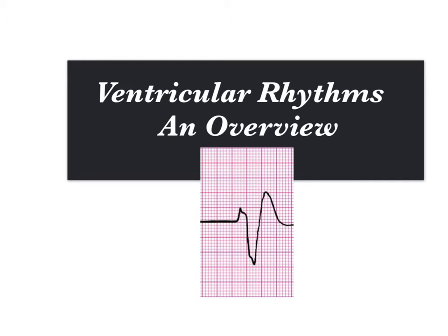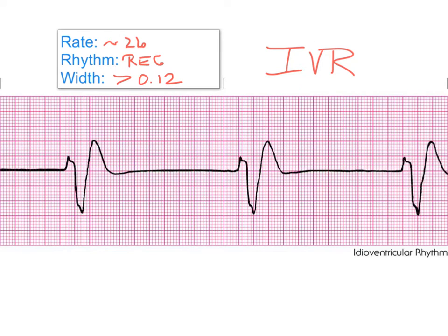I'm trying to get you moving on. I know it seems like a lot coming to you, but continue to work on your rhythms, and I'm going to throw in a couple more ventricular rhythms as we go. When you first look at your rhythms, remember, look at them from a distance. You want to know the rate, the rhythm, P waves, QRS, QRS for P waves, and on and on.